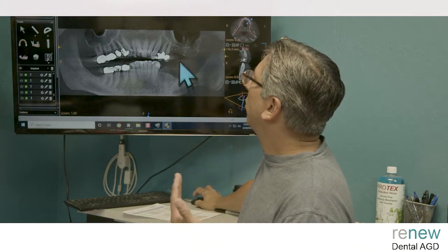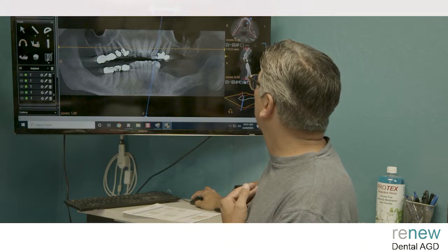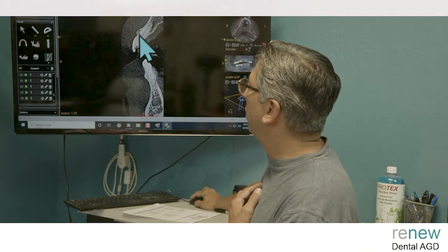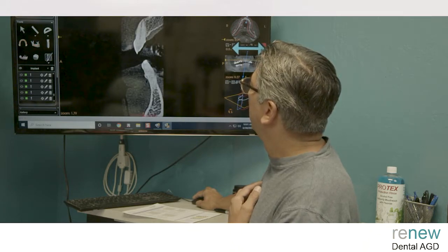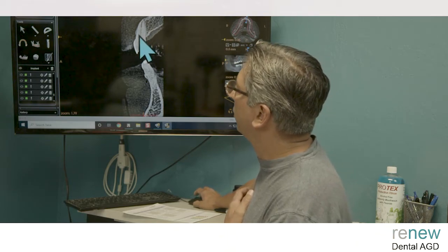The reason why I put orange on there is because you have some teeth that actually look like they're pretty good. They've got a nice solid piece of facial bone out here. But if I look at some other teeth, not so much. Let's look at number 9. You're starting to thin it out here, and you might even have a fenestration if you took that out.